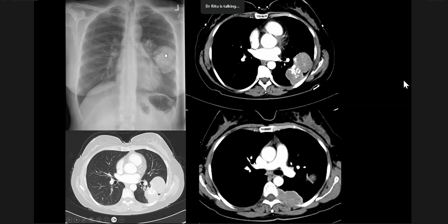Now, Cyprus, as some of you know, is endemic for hydatid disease, and so there was a big suspicion that these, because they were so round and had these areas of calcification, may be hydatid cysts. So she got a CT scan done, and even on CT, you can see that there are two masses.